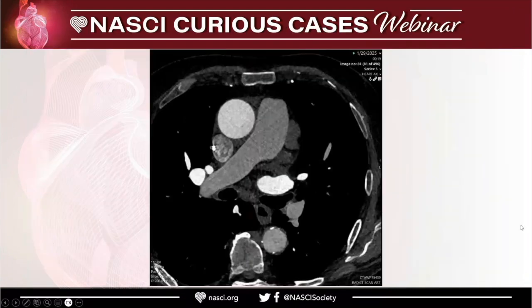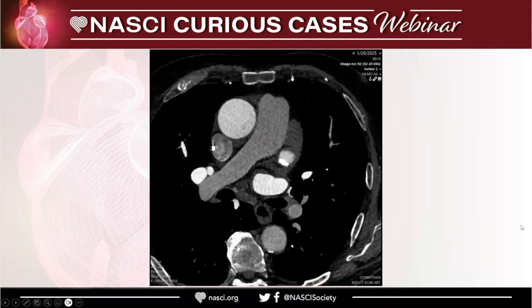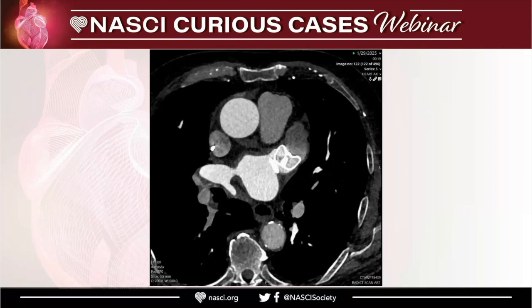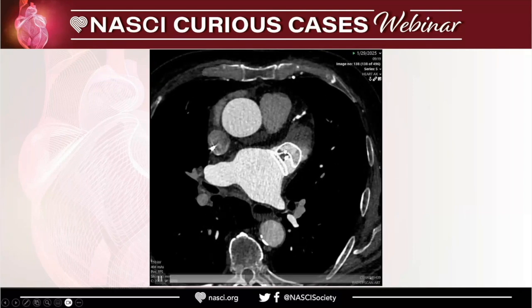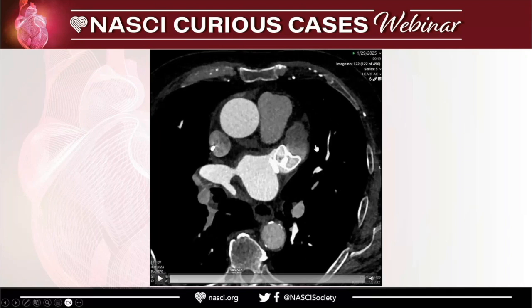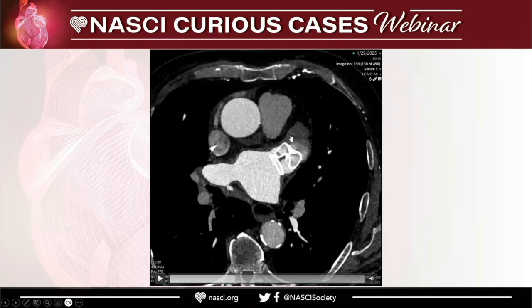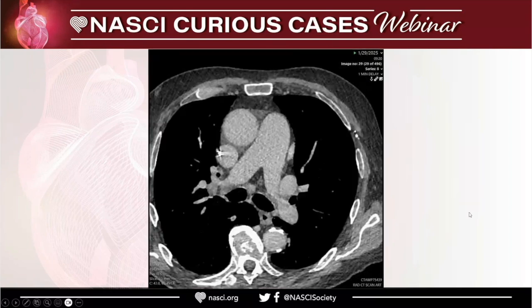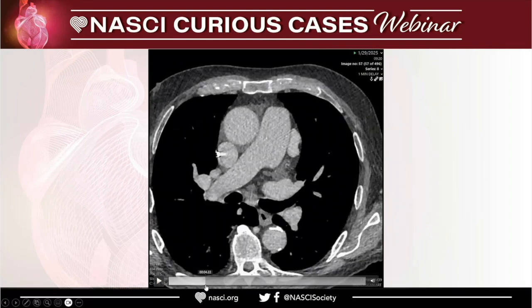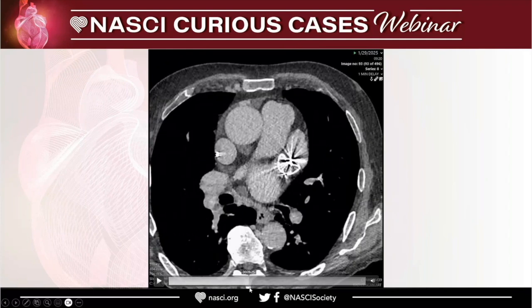So these patients, when we looked at them, I'll go quickly because you already do these kinds of things. I just wanted to know whether you do something different. There is some leak associated with this device. On the arterial phase, we see some non-opacification. But then on the venous, delayed phase, we do a 1 minute delay. If you do it differently, please let me know.